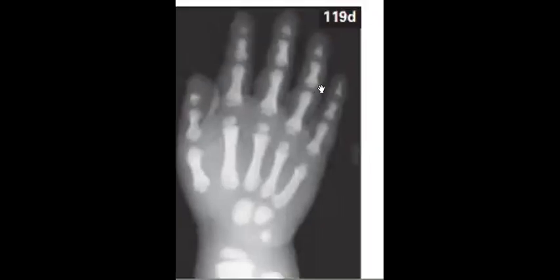Yeah, pointing of distal phalanges. You can consider it like a pointed chalk appearance. Okay. Again, in the forearm with fluorosis, you can see the increased bone density, especially around the ligamentous insertion and calcifications. Okay.